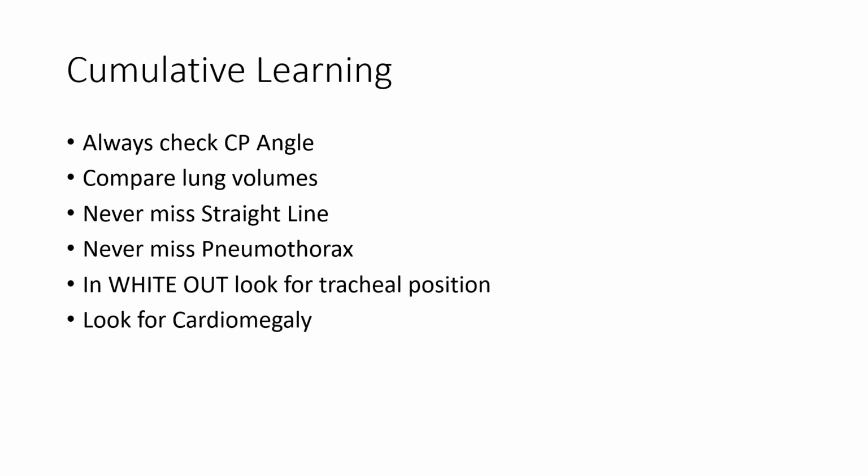So we'll have a cumulative learning session. This is very important because whatever we learned in the previous sessions, I want to reinforce multiple times so that you don't miss this structure and you keep remembering all these things whenever you see x-rays. In the first session I told you always check the CP angle in every x-ray that you see. In the second session I told you to compare the right and left lung volumes in every chest x-ray. In the third session I told you never miss a straight line, it can indicate hydropneumothorax. In the fourth session, never miss a pneumothorax.